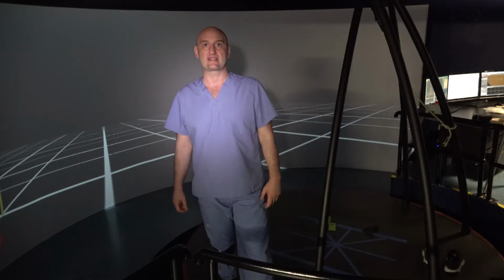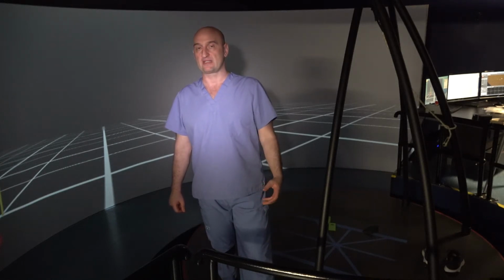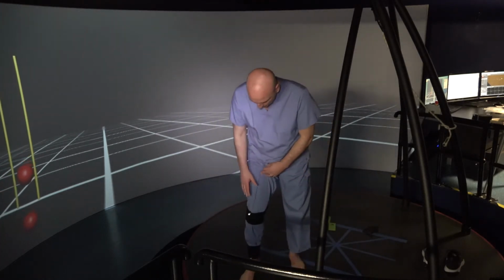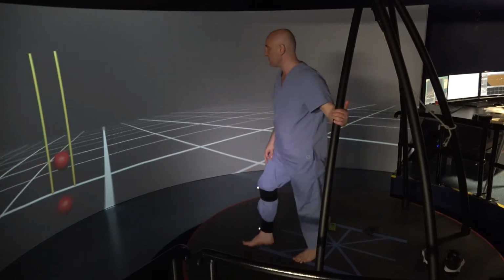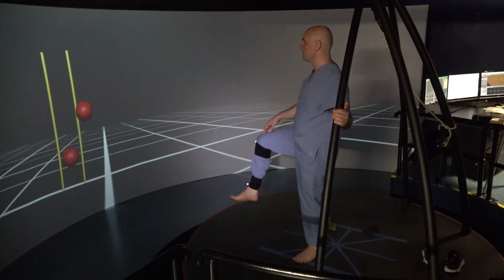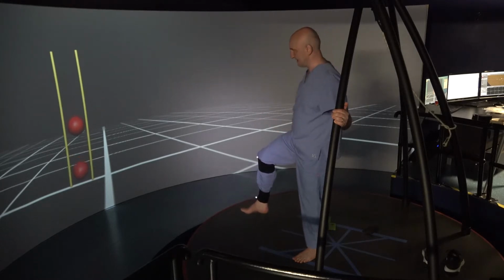Kinematics is the science of measuring and tracing joint angles in real time. So right now I have 2 markers. One is on my knee, one is on my ankle. If you look on the screen, you can see that if I move my foot, the top marker, the top ball, moves out, in and out, and the left stays, and the bottom stays.